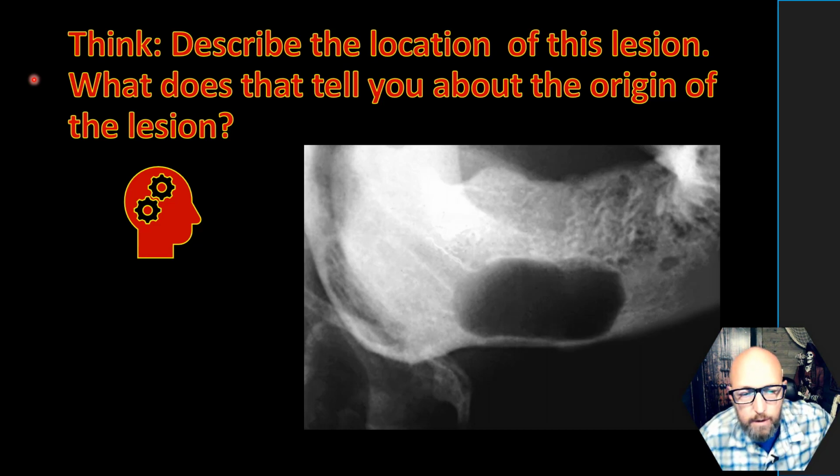All right, what about this one? Location of the lesion, above or below the canal? Or neither, within the canal. Look at the canal borders. They just kind of gently, continuously go around it. Nice, smooth, well-defined, corticated borders to it. But coming from within the canal, likely to be what? Neural or vascular. And the way I describe this with smooth, corticated borders, very round, all those are indicators of something benign. So this is likely a benign neural or vascular tumor or lesion. Likely a schwannoma, just a benign neural lesion.